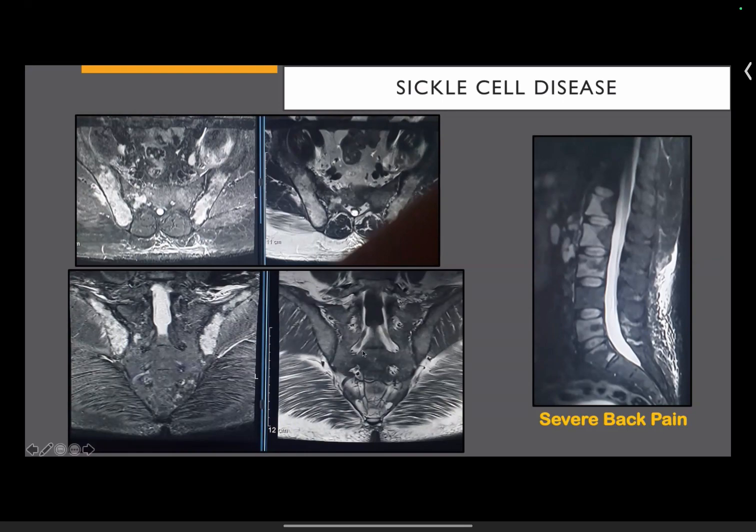I don't have an answer for that. If this patient has a malignancy and you see this, then obviously you'll say these are metastases. But in the context of sickle cell, with a previous history of infarcts and all that, I think you're reasonable to call them infarcts.